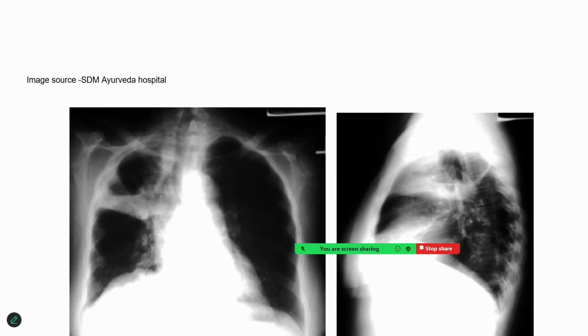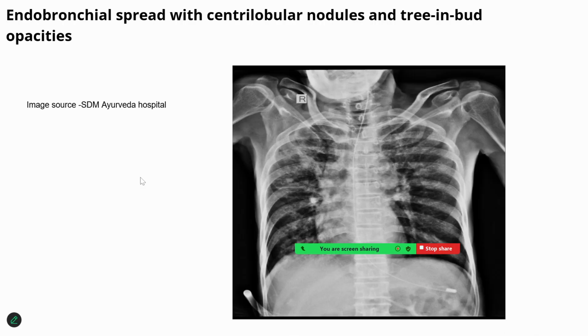Of course, a thick-walled cavity with the displacement, because there is a fibrocystic pathology also. The trachea is displaced to the other side, the area of the cavity. So there is a cavitation along with the shift of the structures, which also could be a presentation of the tuberculosis.